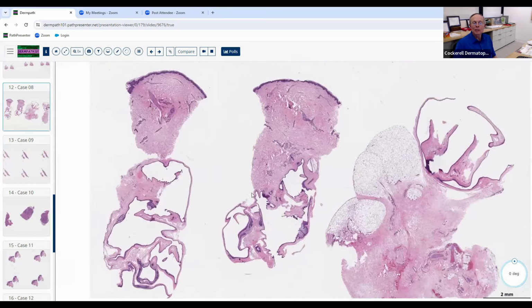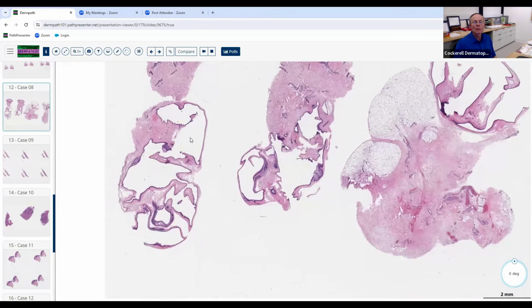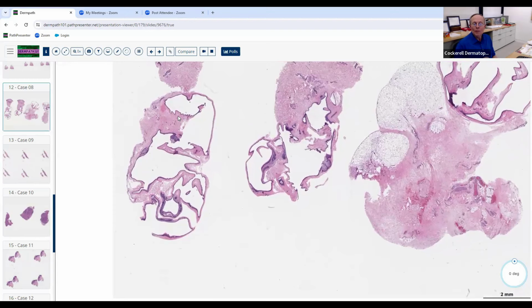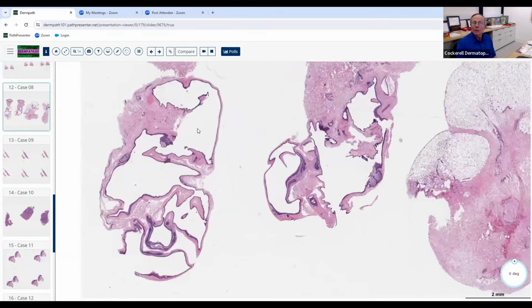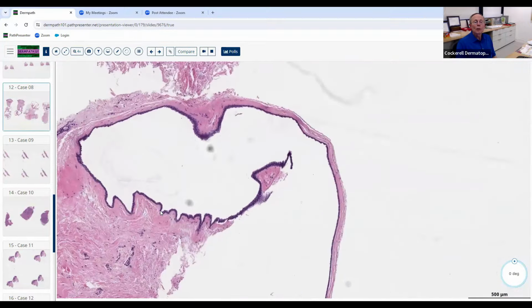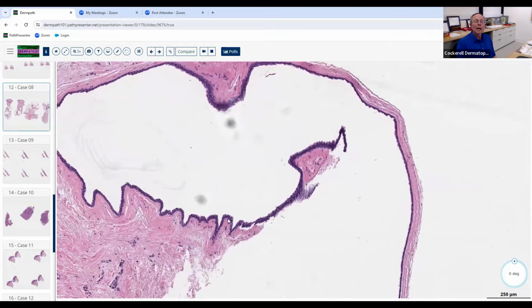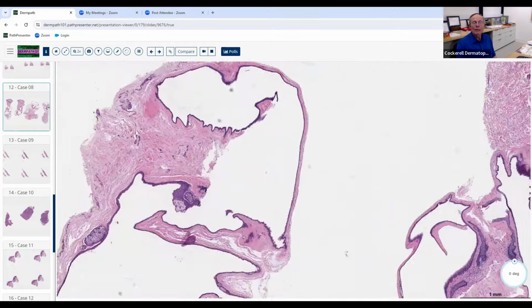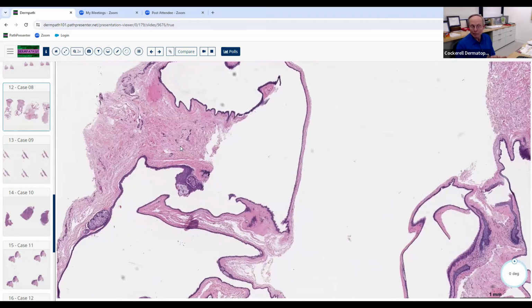And we've got some spaces in the dermis again. We talked about spaces earlier being vascular. Well, sometimes if you get an epithelial lined space, it can have a central area that's kind of clear. And so it might be a cyst. And as we go to higher magnification, sure enough, it is a cyst. And so we ask ourselves, well, how do we name cysts? Basically, we name them by the type of epithelium that lines the cyst.